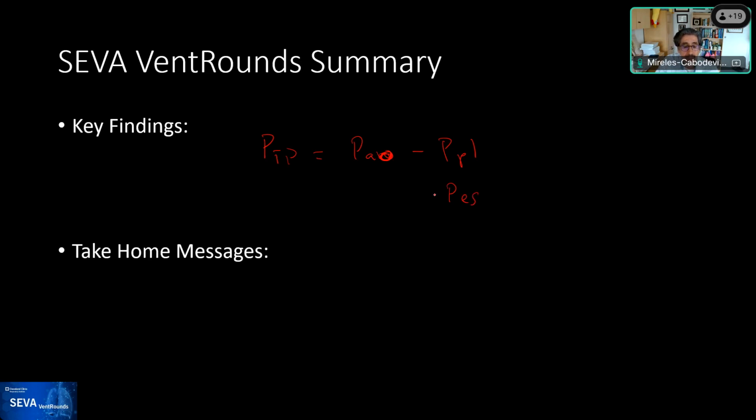A thing that commonly makes an error is to think that this is the transalveolar pressure, which is the alveolar pressure minus the pleural pressure. Do remember that these two become approximately equal under static conditions. That's why we do the pauses to see those two.